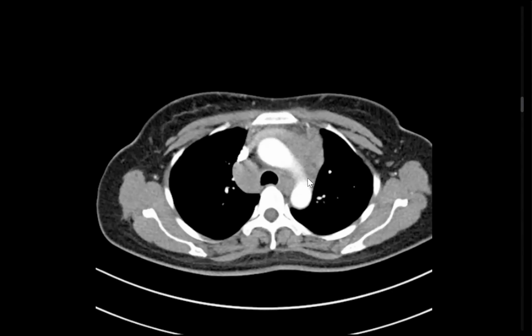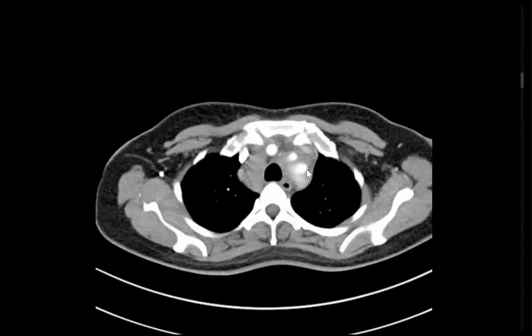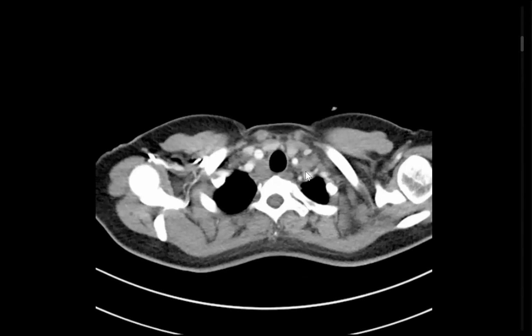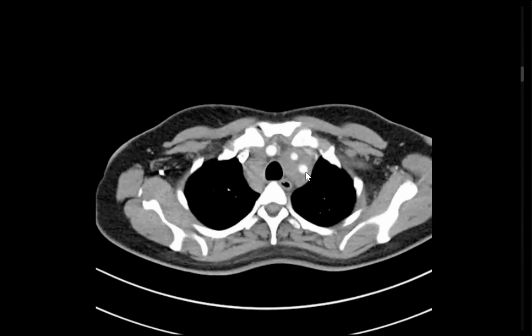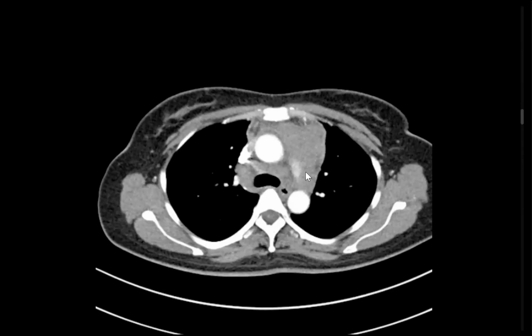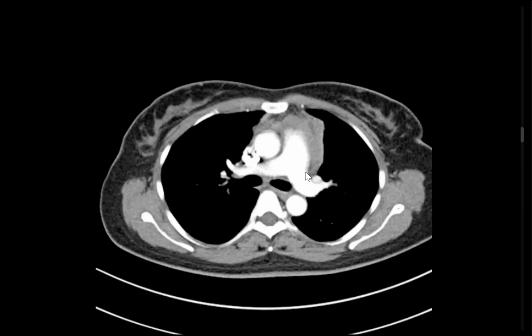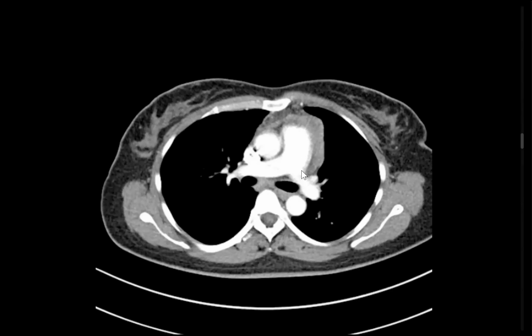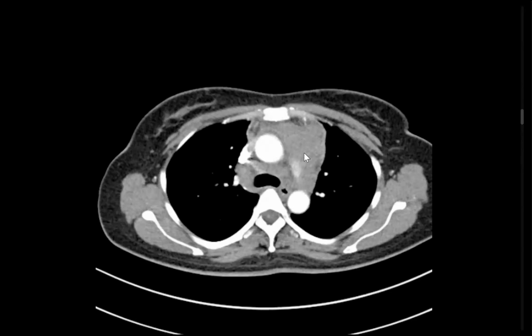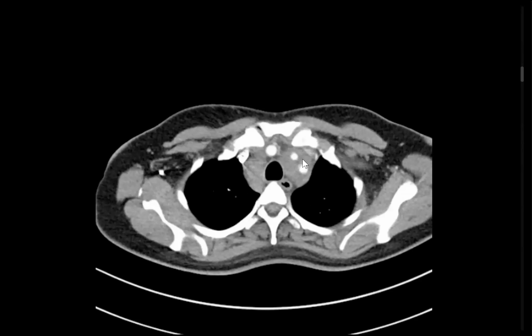So keeping in view the lymph nodes and this lobulated mass, it's likely a lymphoma. I would convey my findings to the referring physician and advise histopathological correlation, and also complete CT of the chest, abdomen, and pelvis for staging, to look for any other areas of involved lymph nodes. In my routine practice, I would also review the lung window and bone window to look for any deposits in them. Good. It's a lymphoma.